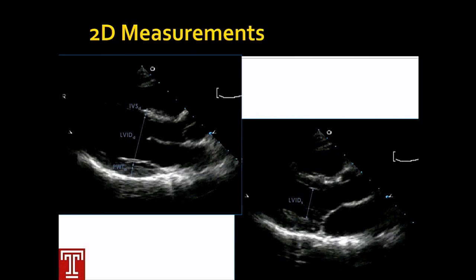Sometimes the rest of the chamber looks rather large, but if the technologist or the physician measures too close to the mitral valve, you get that sort of falsely shortened internal diameter closer to the base, where the sigmoid septum is actually bending in. So I tend to be a little bit more liberal with my mid-chordal level of measurements when I have a patient with a sigmoid type septum, otherwise known as disproportionate upper septal thickening by some.